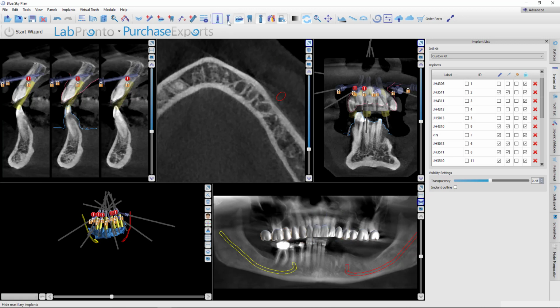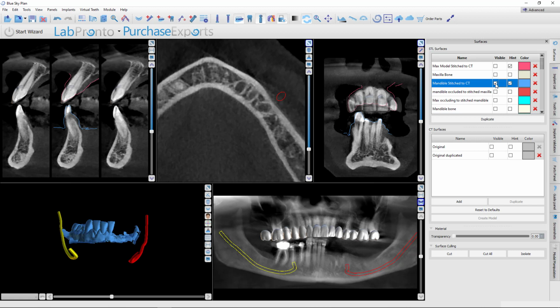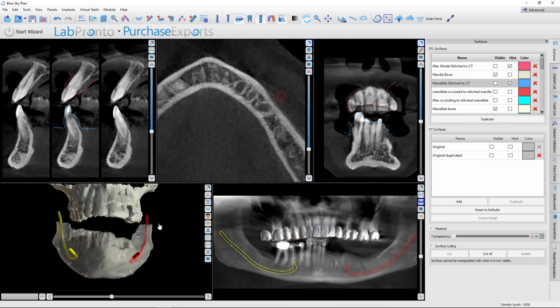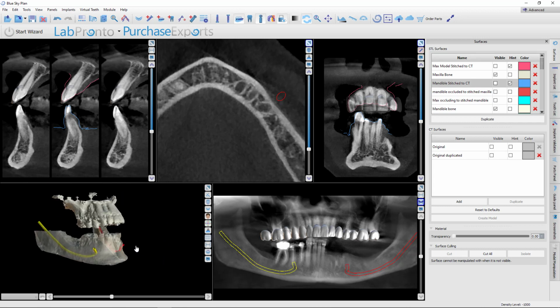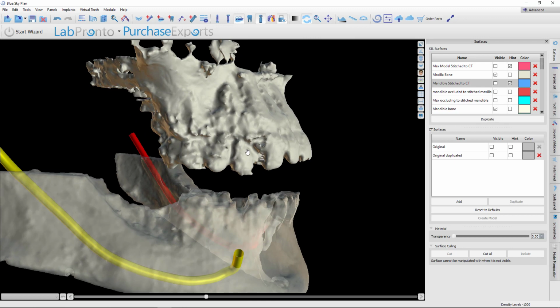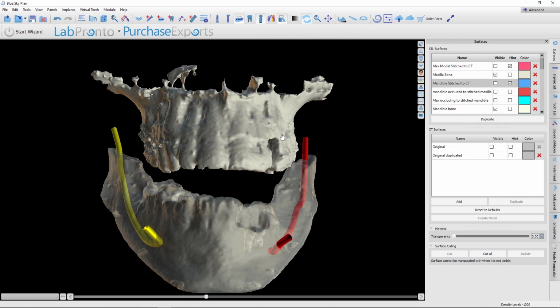We've done our prosthetic planning. We've done our smile simulation, figured out where ideal teeth need to be, and then planned the implants backwards from those. And now we need to do the segmentation. So we did a segmentation of the maxilla and a segmentation of the mandible. Now, one thing you'll always experience is that when you segment the teeth, it's really, really low quality, right? And I want to make guides that can actually index onto the incisal edges for positioning my bone reduction guide. That's going to be the most accurate way.